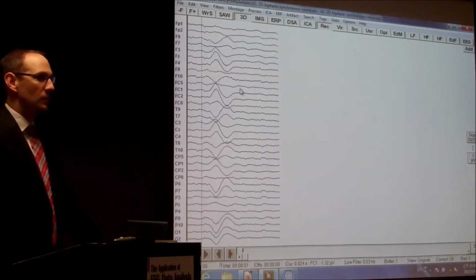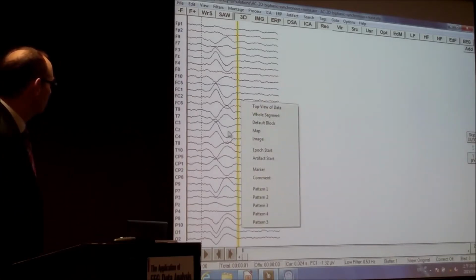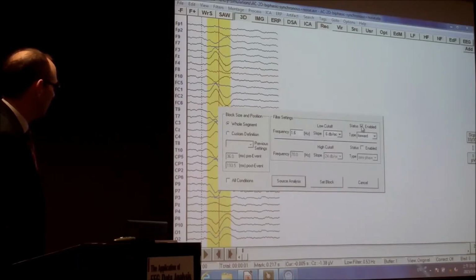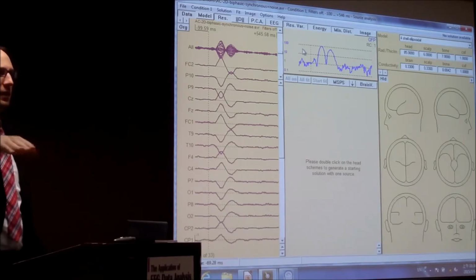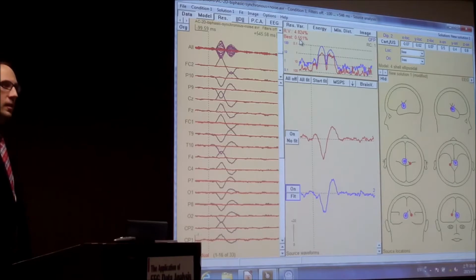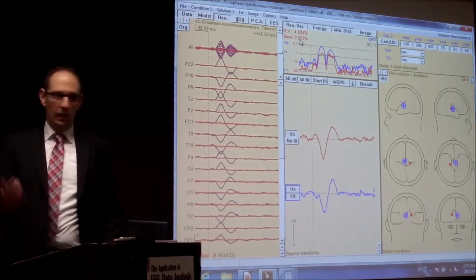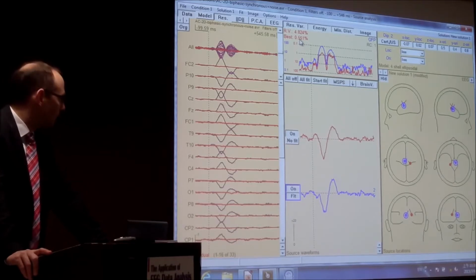So now we have noise in it. So now we will have a considerable signal, which is in the end, which is unexplained. So now you can see the signal here is not a clean signal. You had a flat line at the beginning, then there was a signal, a flat line at the end. Now we have noise with the whole thing. What we now can do, we can again have a fit, and now you see you have a considerable amount of residue left. You see residue variance, 4.82%. Still a very good number, in fact, but for sure it is now a considerable number of noise left here.